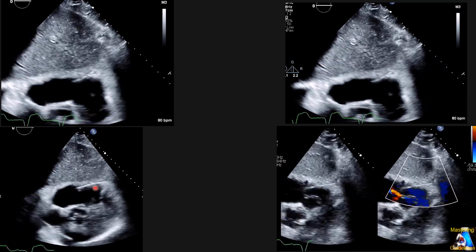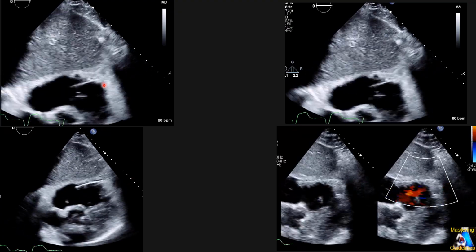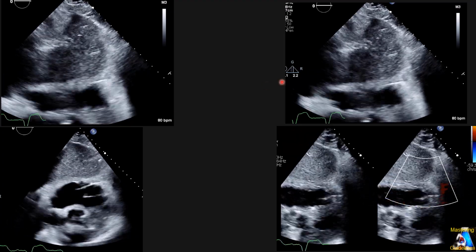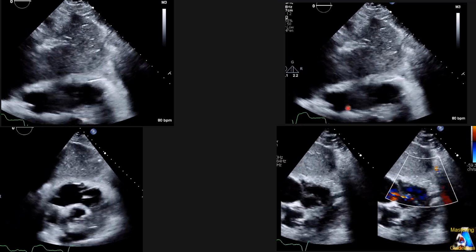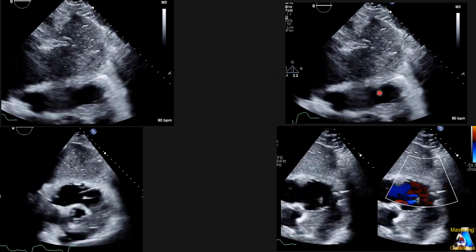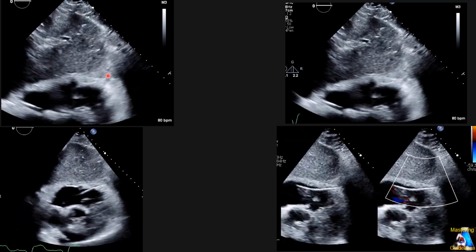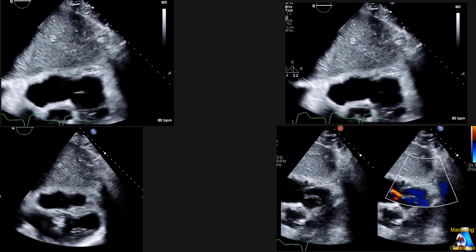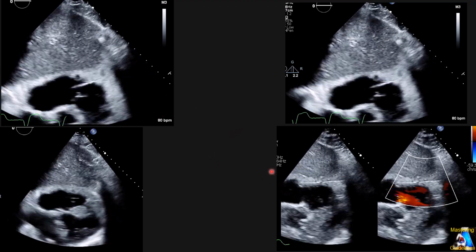As you can see, the tip penetrates completely through the right ventricular free wall, close to the apical third, and with color everything evened out. The patient didn't have any pericardial effusion, so it was withdrawn successfully in the cath lab, and the patient was stable.